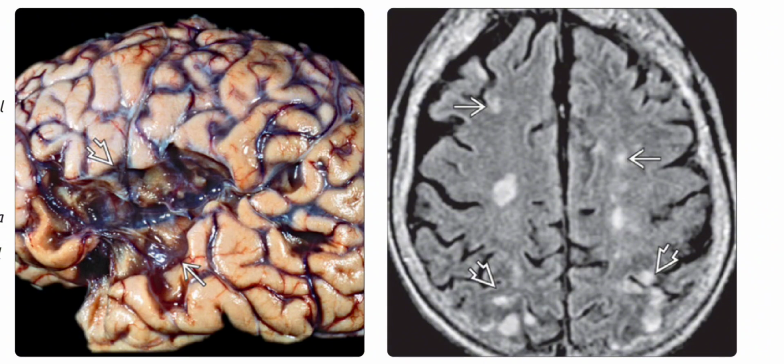Right is the axial FLAIR MRI, and it shows multiple hyperintense foci in the watershed zones between the major cerebral artery territories, that is MCA, PCA, and ACA, related to acute ischemia from hypoperfusion. The posterior confluence, where all the three vascular distributions meet together at the vertex, is especially vulnerable to cerebral hypoperfusion.